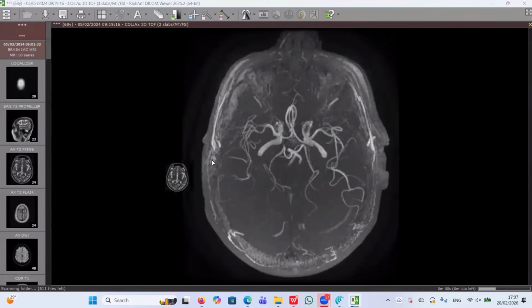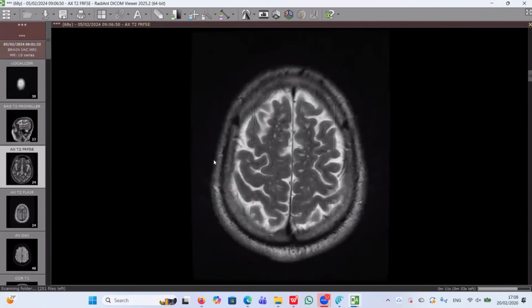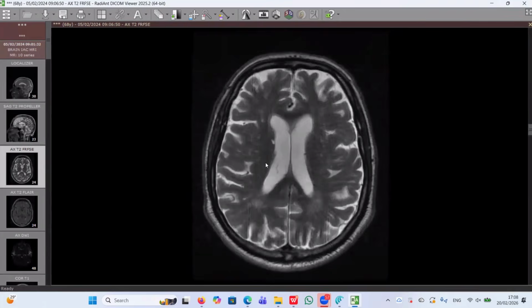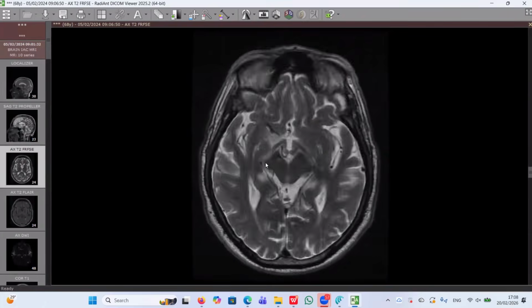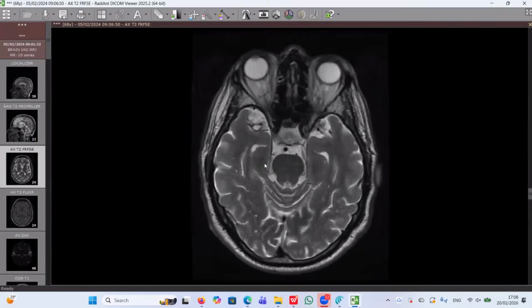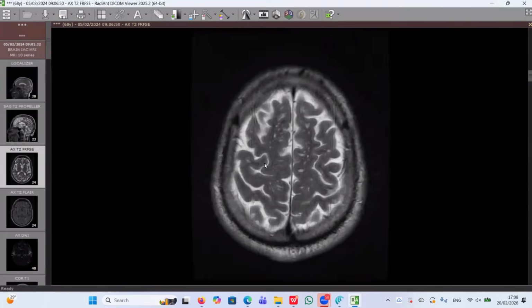Yes, sir. Okay. Candidate number 1, this patient came to you in the ER complaining of right side hemiparesis, acute hemiparesis. Okay, I will scroll for you. Give me the idea. This patient is 68 years old.